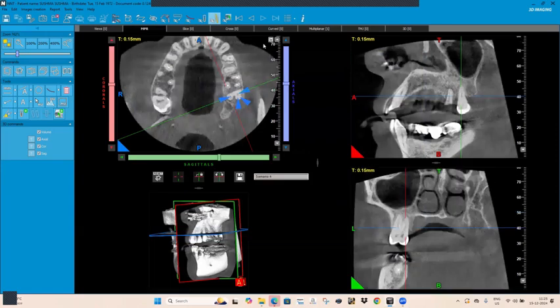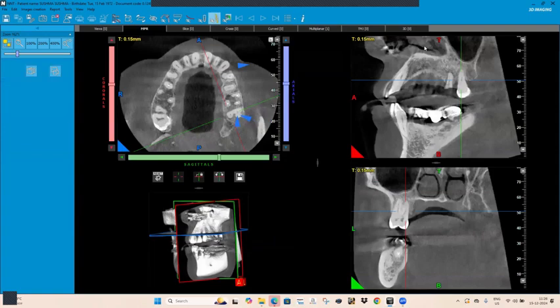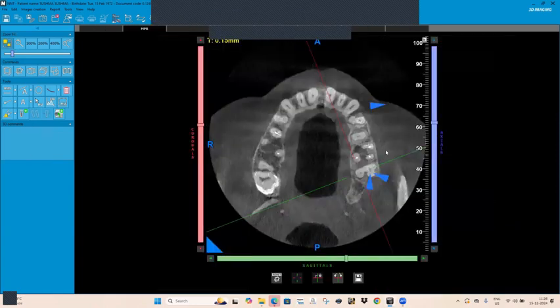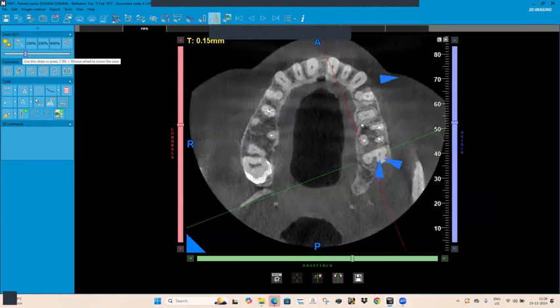See, I'll show. Now I changed the sharpness a little and you can see. Even we can use the right side filters, gray color, blue color, and red colors. Now the image is much better than before, I think, if you're able to see.